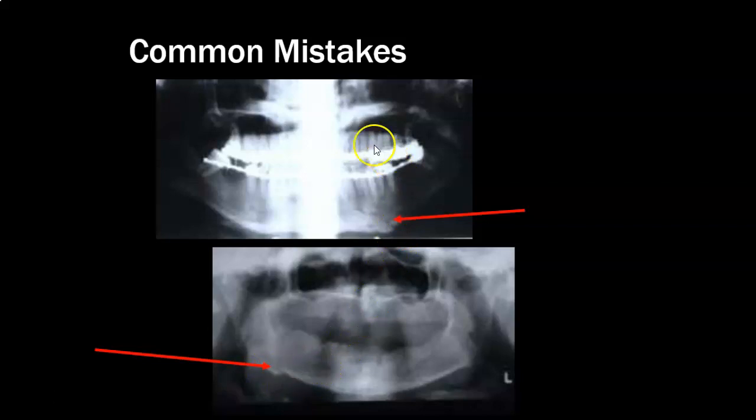error. So we don't really interpret these, the doctor does, but it's really, really helpful if we have a very good understanding of this kind of stuff. That's why we talk about it. But the more you stare at it, you can kind of see this zigzaggy line. It's like, okay, that's a fracture. And this is just a wave from the patient moving.